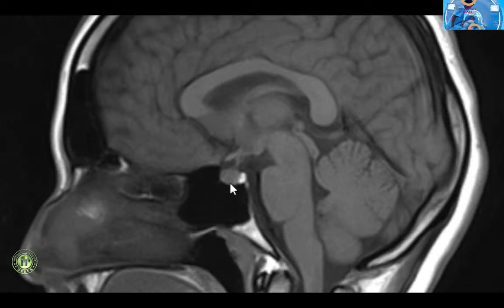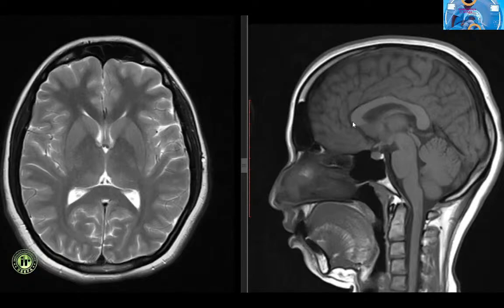The posterior lobe of the pituitary appears hyperintense on T1 weighted images due to the presence of the neurosecretory granules within. In neonates, the pituitary may appear uniformly hyperintense. The limbic system comprises of the limbic lobe, olfactory apparatus and septal areas. We shall be discussing this separately.